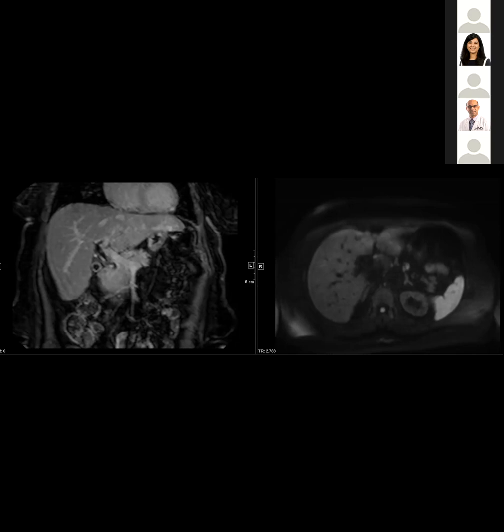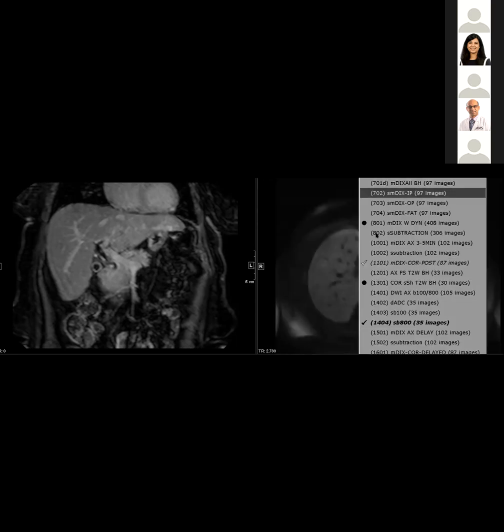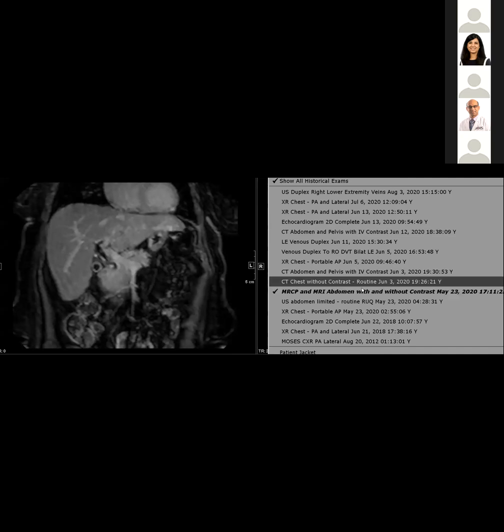And then I guess also, common things being common, adenomyomatosis is extremely common, so my eye tends to go that way. But like I said, this case, I wouldn't pass it as adenomyomatosis. I would have at least recommended an ultrasound. And the other thing I was going to ask is, Victoria, don't you think that based on the ultrasound appearance, maybe the wall is even calcified here and we just couldn't see it? It could be.